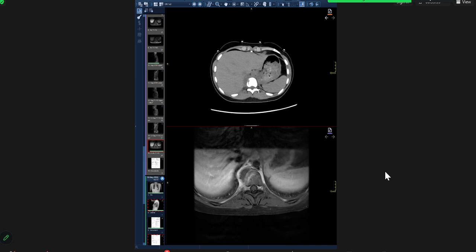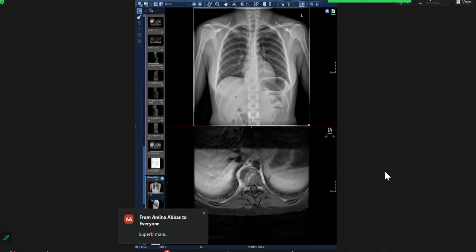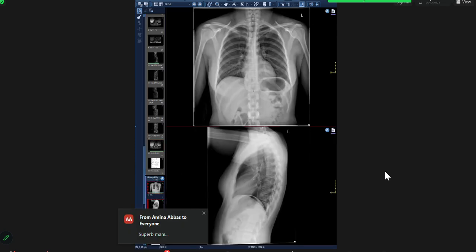So we'll label this patient as a paraspinal abscess. Yes, this is a paraspinal abscess. When you are describing X-rays, you have to leave room for yourself. Don't try to exclude things too much. Always remember in these exams, you have to get rid of the X-ray, because for some cases, like sickle cell, the X-ray is diagnostic, but this is not diagnostic. The next thing is going to be coming.